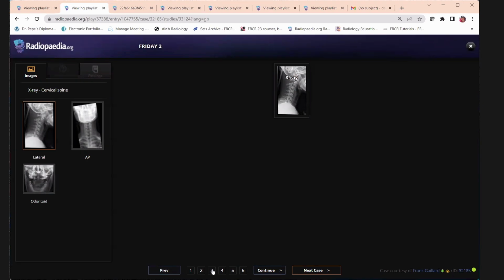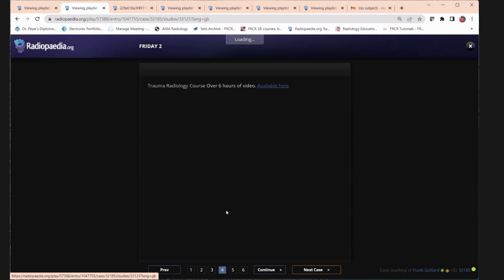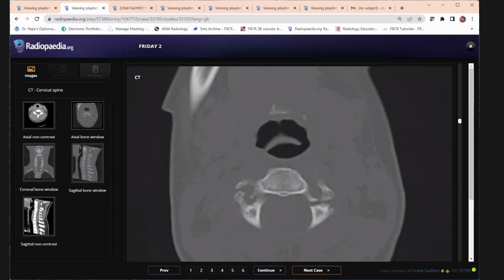Dr. Dipti, did candidate 1 speak about immobilization of the spine? No, she did not talk about that. If the spine is not immobilized, you have to urgently do it to prevent further injuries, as well as look at the vessels for any flow void or any injury.